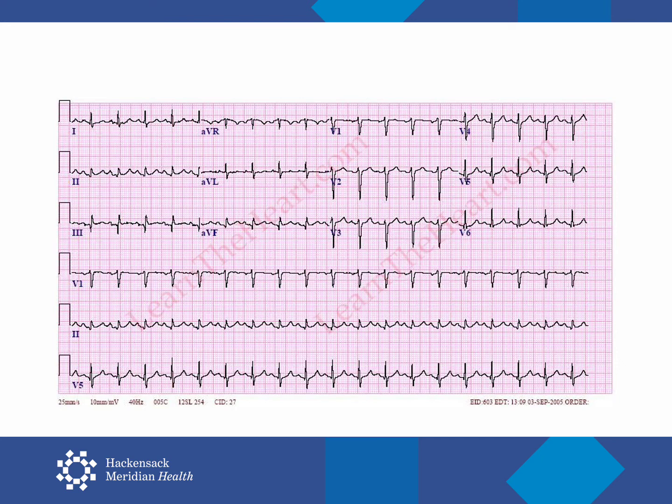This is sinus tachycardia. Now, the secret to sinus tachycardia is to figure out what's causing it, because causes can range from benign to life-threatening, and generally include on the threatening side pulmonary embolism, ischemia, myocarditis, as well as fever, sepsis, anemia, dehydration, thyrotoxicosis, and drug or alcohol withdrawal. Then there are less threatening causes such as pain or anxiety. Finally, there are chronic benign syndromes of sinus tachycardia. In order to send somebody home from the emergency department with sinus tachycardia, you need to be sure that you've excluded any of the threatening causes. But that's not really part of the triage sign-off process, so let's move on.